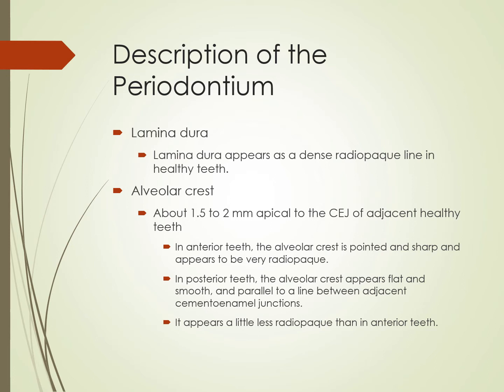And that's okay. It's not quite as radiopaque because it's a thicker structure, right? We're looking at more space there. So it's okay if it's not quite as perfectly arched and it's not quite as radiopaque, and that's okay. It doesn't necessarily mean that it's unhealthy.